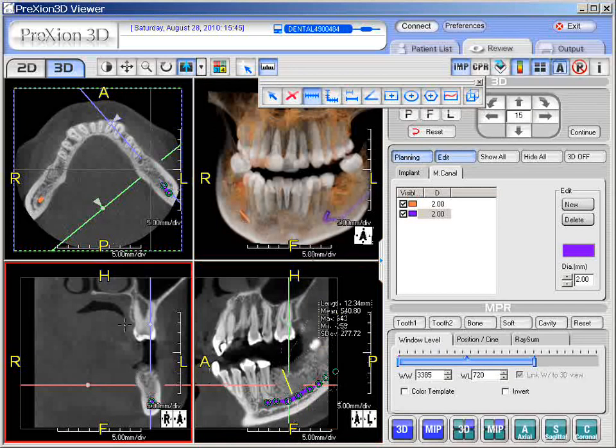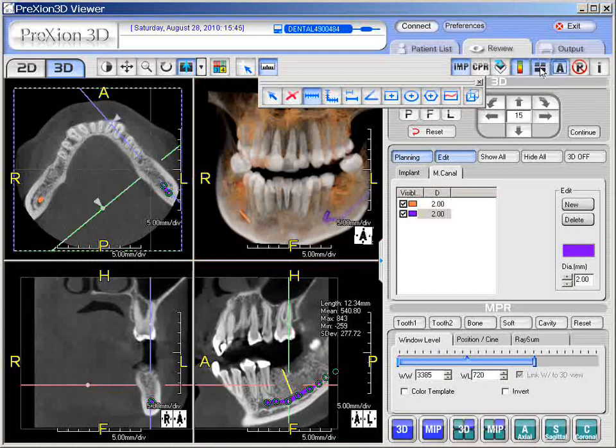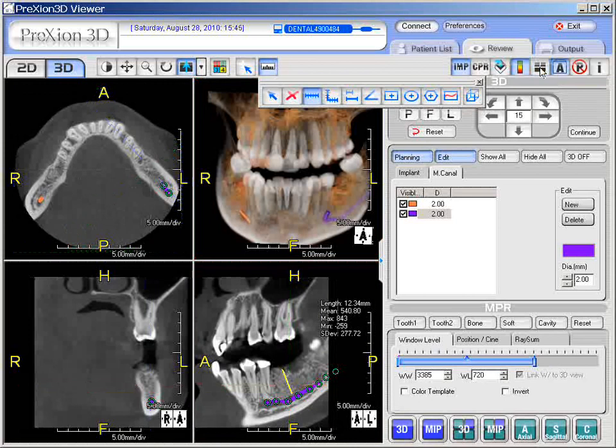By the way, these lines, the crossbars, you can temporarily take those off by coming up here to the enable disable cross cursors, just little 4 black squares, just like a toggle. It puts these on and off, just like that. So let's take them off for a second, just for measurement purposes. So we've got one measurement here in sagittal. Let's measure the outer to outer edges here. Actually, let's first go to the top of the ridge and take a secondary measurement from the ridge linearly down to the top of the mandibular canal.